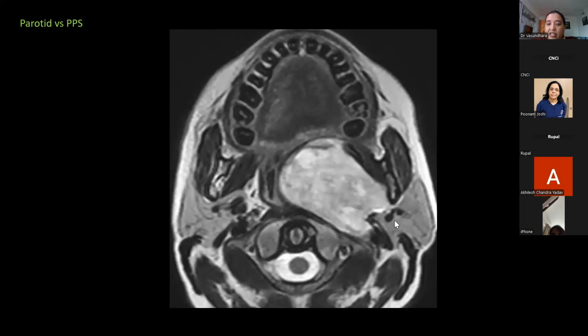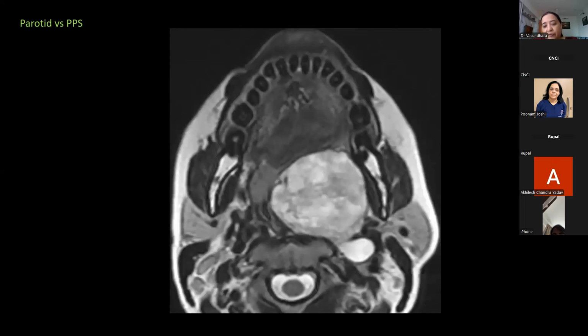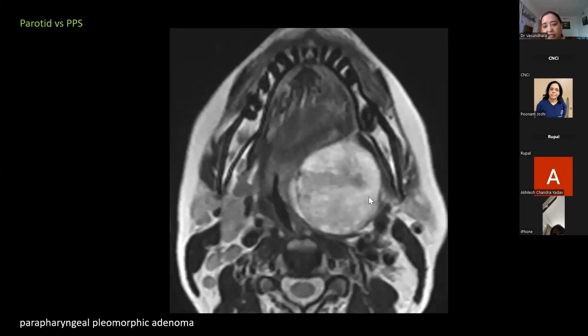And your incision varies according to this. So depending upon the displacement of the styloid and the push on the carotid, we can tell whether it is from the parapharyngeal space or the deep lobe. So this was a lesion extending right downward till the submandibular region.